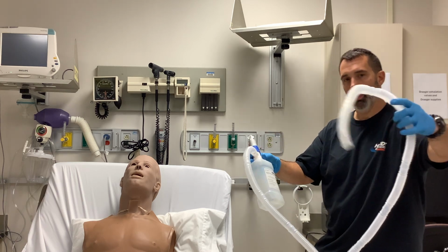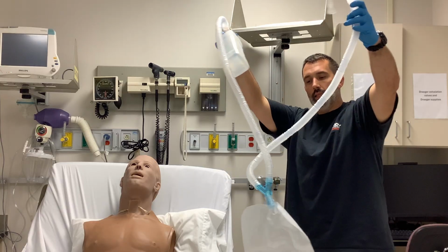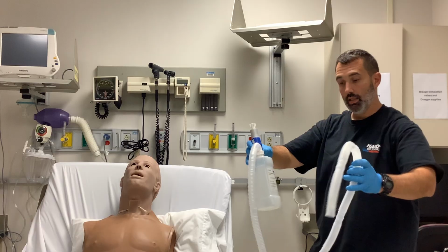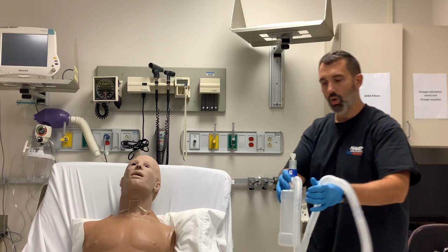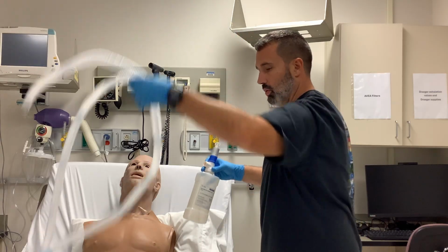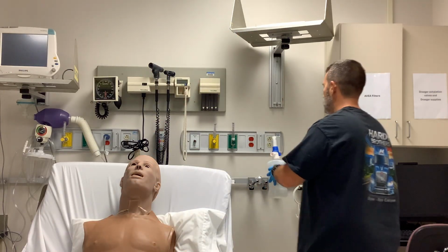Your aerosol mask, face shield, or tracheostomy collar is going to go to the other end of that. You have a bag that's capped, and it needs to be at the lowest point so that any water that collects can drain in there, and make sure it's capped so that the water doesn't go on the floor and you don't slip and fall or turn into a slip and slide or something of that nature.